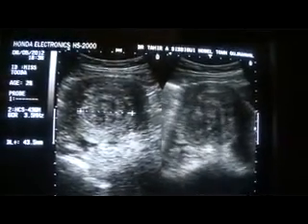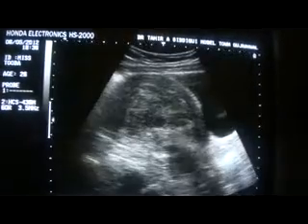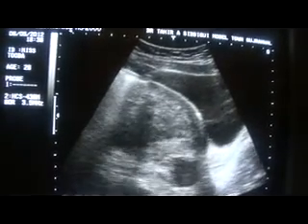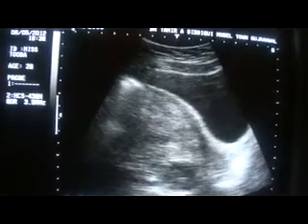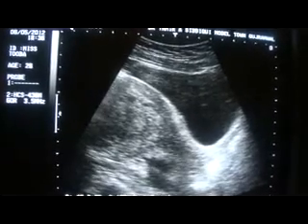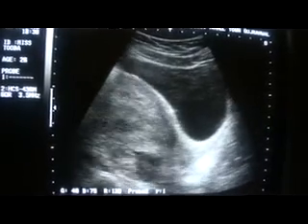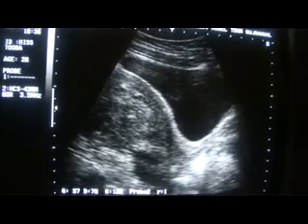Without any investigations provided to you, what will you describe this finding as? Well, the approximate volume of this fluid, it's not exact, but we can have an approximate volume, is more than 130 cc, 130 mLs.